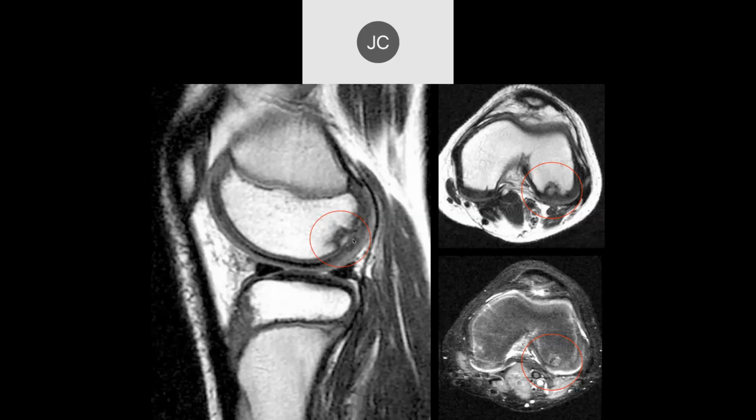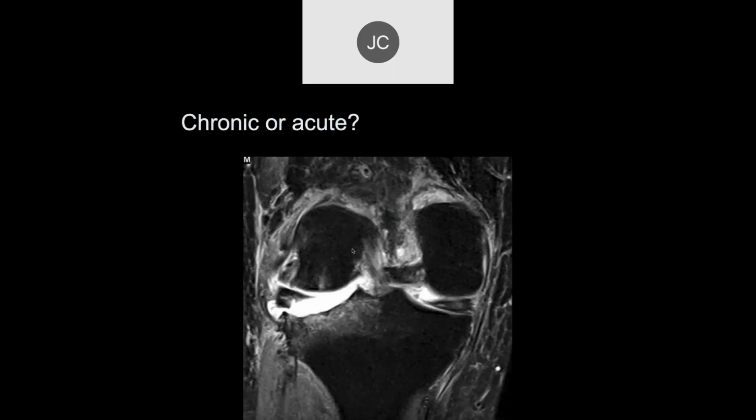The patient needs to be off active weight bearing to allow these to heal, or they'll go on to an irreversible lesion. Yeah, you can nail that, but you need to go from the side.